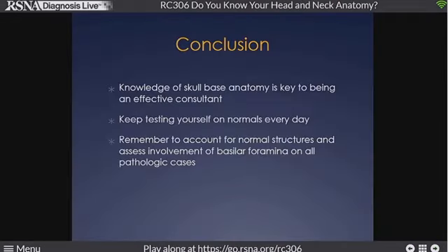Excellent. So we've talked a bit about skull base anatomy. We looked at some cases. We looked at some foramen. I again encourage you to test yourself on normals every day. That's part of the fun of being able to sit at the view box and keep stacking up that knowledge in your head that you've seen this before and you know exactly what it is. Account for the normal structures and it makes it a little easier to assess for involvement of the basal foramina when you're looking at pathology.